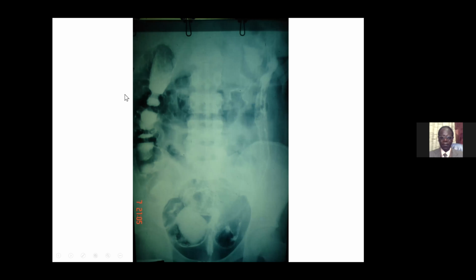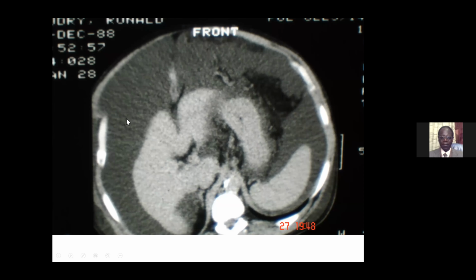This is a CT of a patient. It shows distension. This is a low density area, which is demarcating the skin from the liver, which is also shrunken in size. This is ascites. This is how ascites looks like. So this ascites is under tension, and this is the stomach. You can see the different walls. It is collapsed, so it looks like a very thick muscle. In fact, it is very muscular.